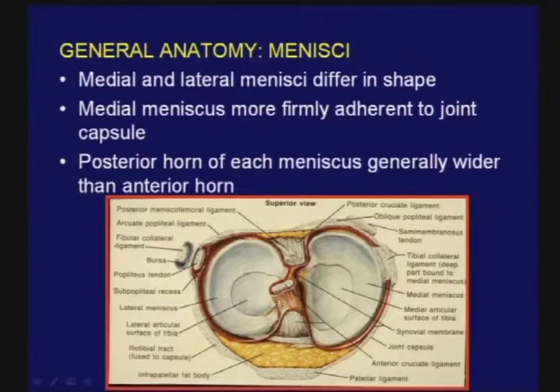The cruciate ligaments are intracapsular and extrasynovial. Here, of course, is one of the ligaments that connects the meniscus. It is not the only one, but it is the most common one we see.